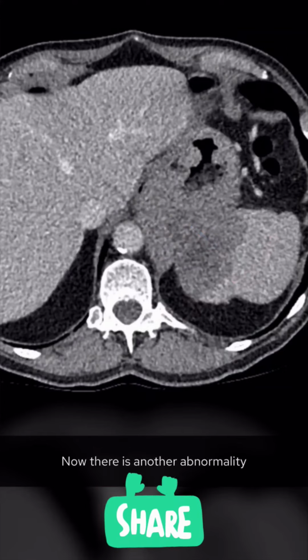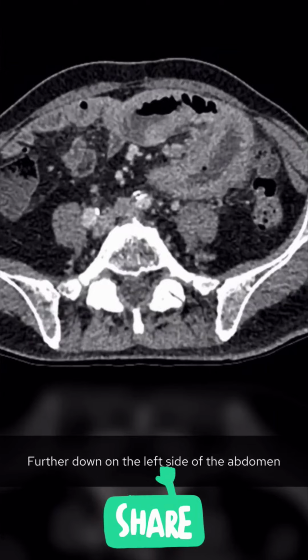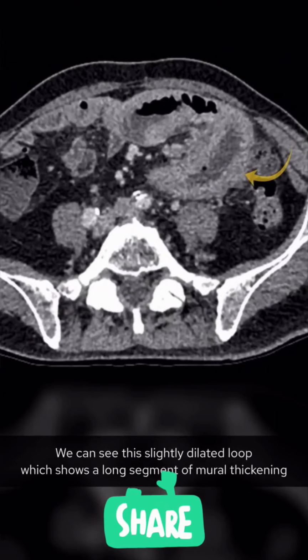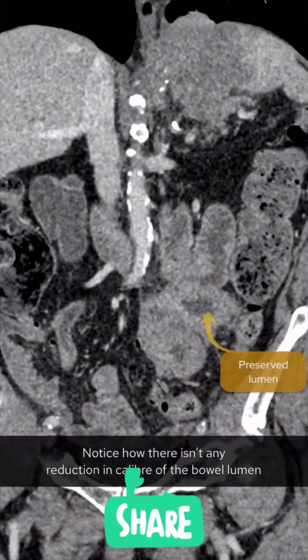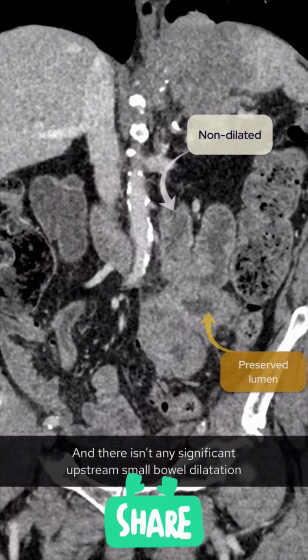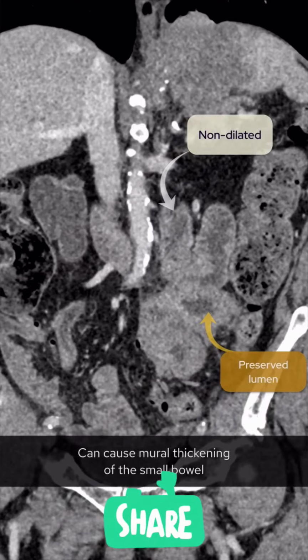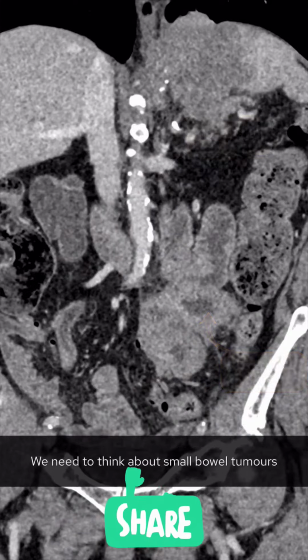Now there is another abnormality. When we look at these loops of jejunum further down on the left side of the abdomen, we can see this slightly dilated loop which shows a long segment of mural thickening. Notice how there isn't any reduction in calibre of the bowel lumen, and there isn't a significant upstream small bowel dilatation to represent obstruction. Although pathology like Crohn's disease and infection can cause mural thickening of the small bowel, given the abnormality we've seen in the stomach, we need to think about small bowel tumours.